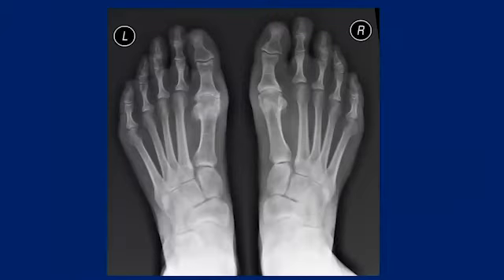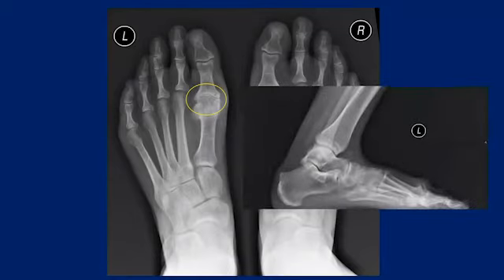Next, an AP view of both feet combined together, looking for comparisons. Sometimes we do this film type if we're looking for Lisfranc injuries. We can see that on the left side there is non-uniform joint space narrowing with subchondral sclerosis, more severe than on the right. Next, a lateral view of the same patient, where we have dorsal osteophyte formation, soft tissue swelling, and an intracapsular ossific body to define the presence of hallux rigidus.